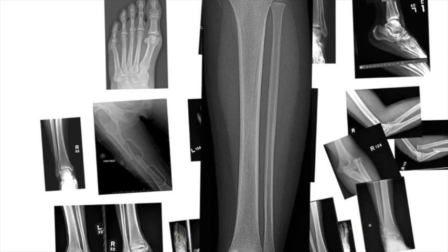Remember, if you're clinically suspicious and you're not sure if it's a fracture or not on the x-ray, you can do other views, you can do comparisons to the opposite side, or you can directly palpate, and if the patient has pain in a suspicious area, then it's probably a fracture. But beware, because vascular channels can look like fractures. They typically won't be malaligned. You may have a lucency that goes through the cortex.